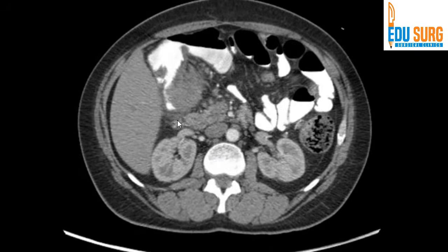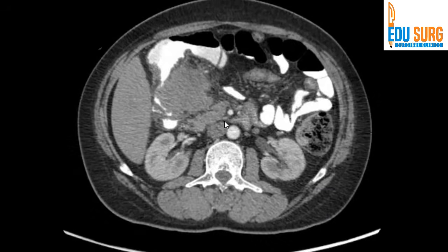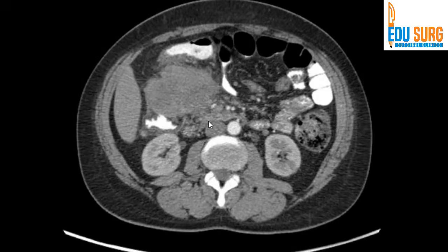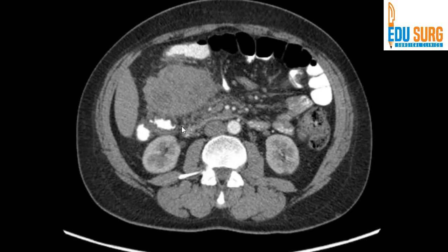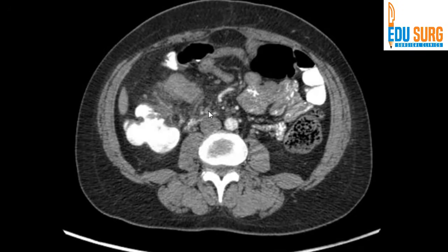That's the D2, D3 area, and now the tumor has started. So you can see that there is a plane between the tumor and the duodenum, D2, D3 area, and this is the duodenum, this is the tumor. So again, a nice plane. Of course, you will find adhesions when you are dissecting this area, but there is a plane. You can see some veins in this area. We'll see that in the portal venous phase. Portal vein.